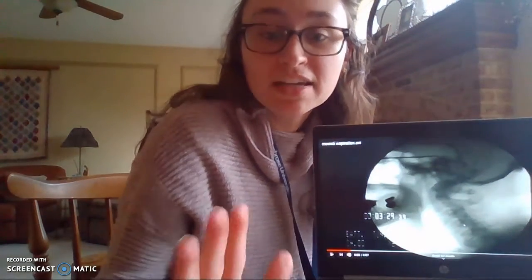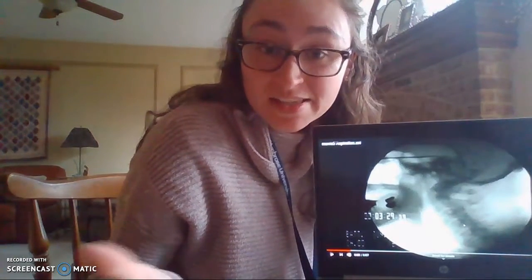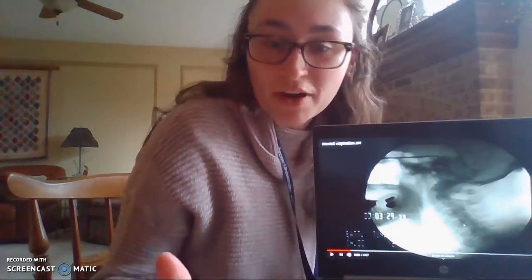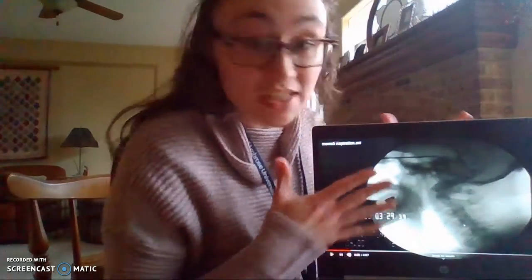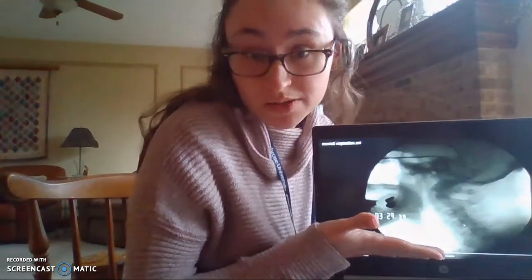I'm Grace from Speech, and I was hoping to go over the swallow study x-ray that you had done earlier today. So is that okay? Perfect. So I'm just going to orient you to what you see here on the screen. This is what I saw during your swallow study.